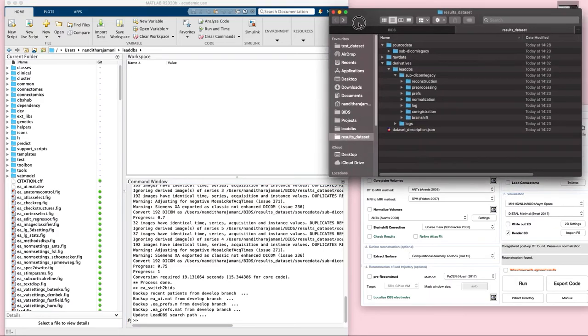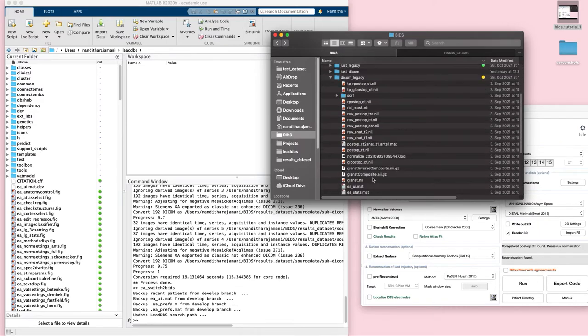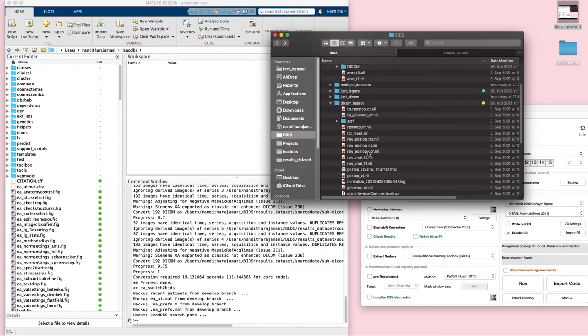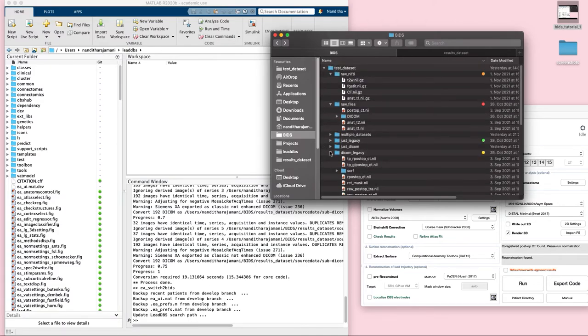In order to explain some of the old dataset types that you may have, I have a few different test datasets here, which include raw NIfTI, and then raw files, which include both DICOM and raw NIfTI files, and then a legacy dataset containing both a DICOM folder as well as the classic Lead-DBS files, which you might be familiar with if you've used Lead-DBS before. So let's start with the raw NIfTI files.